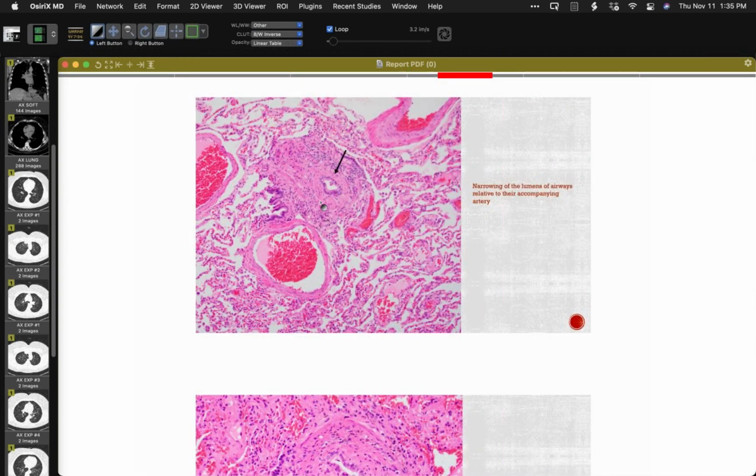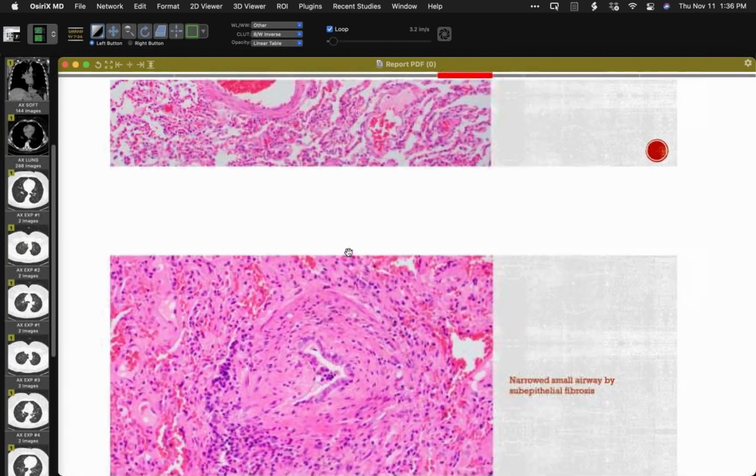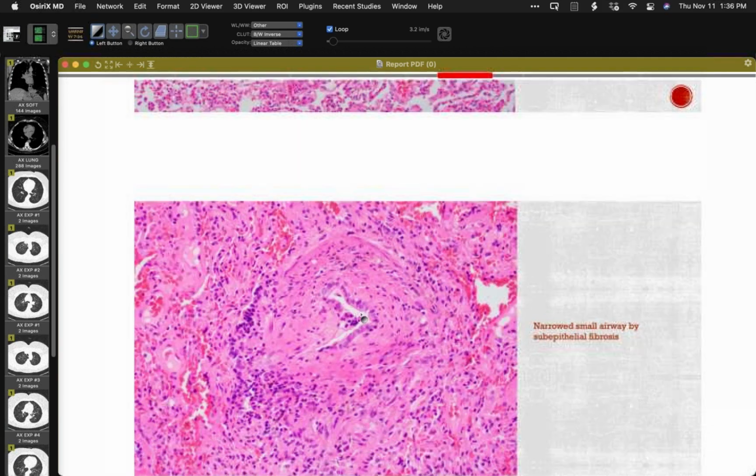Here is a bronchovascular bundle, airway, and companion artery. The distance between here and out here, the pink stuff, is substantially increased. Let me show you this to better advantage. Here we have respiratory epithelium. Right here we have the relatively slender nuclei, just there and there, of smooth muscle.